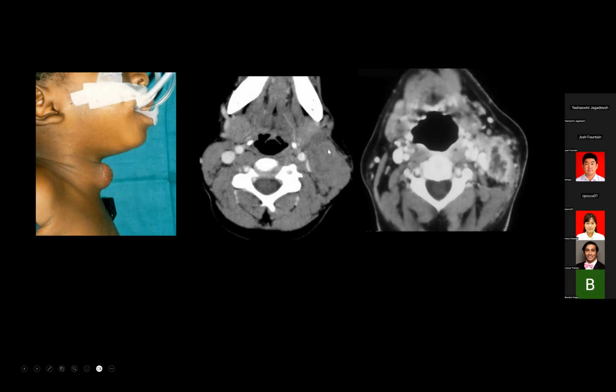We don't see this in the United States very much, but I know we have people on this call from Asia, and especially when I go to India and South America, if I see something like this and then I see this lymph node on the left, well, I'll tell you what ended up happening in this case. So this is a patient that has a conglomerate nodal mass on the left side of the neck in a child. This was actually a young adult that I saw in tumor board back when I was at UNC. This is back in the last century, but I like to keep these old cases because, life's about storytelling. So I looked at this and I said, this is a metastatic nodal disease. This was actually at our head and neck tumor board.